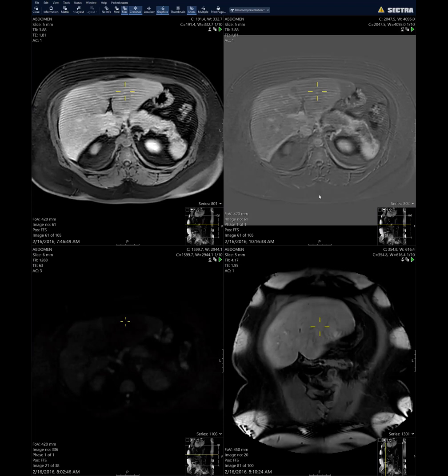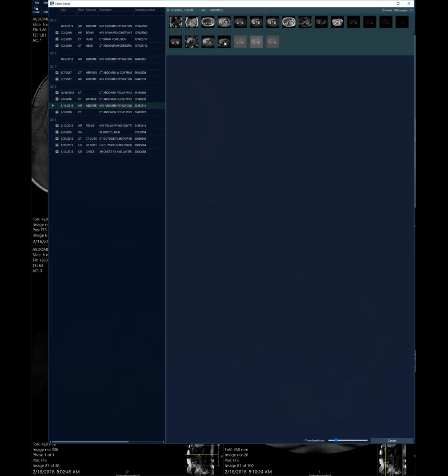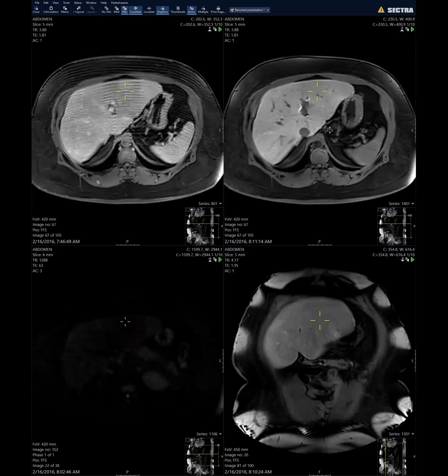Probably not to this beautiful uniform extent. Yeah, that's what I was wondering. Like usually those adenomas aren't so homogeneous, right? Right, but let me see if I can pull up the case that I'm thinking of.